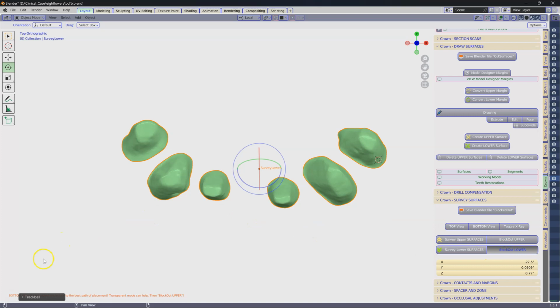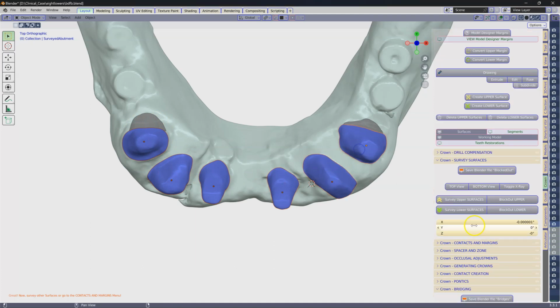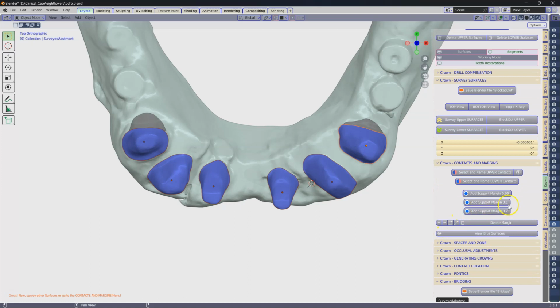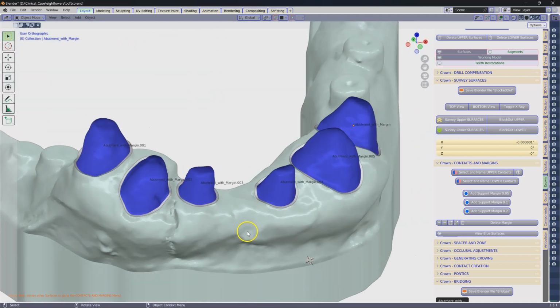Block out lower. This is what I've been meaning. Now if we're making support margins, we will see them jut out on the distals. So let's put 0.2 on there. You'll see the margin come out to meet the block out, and this is done for good purpose. Otherwise this crown is going to end up without a distal edge or distal wall. It'll just be completely cut away, eradicated.